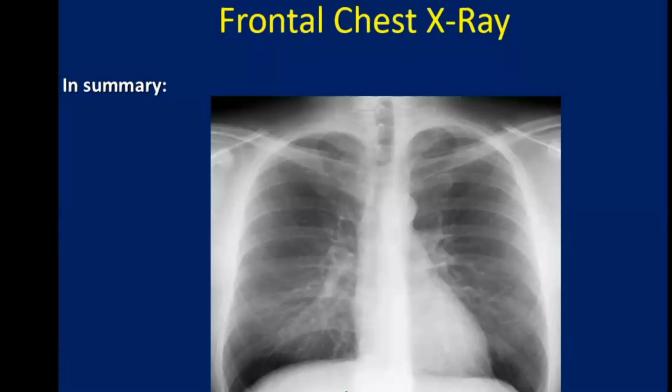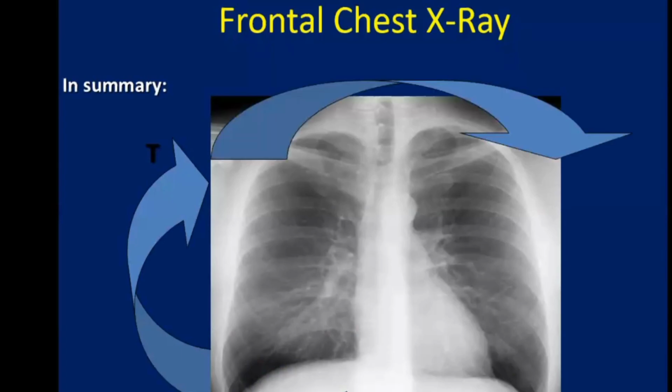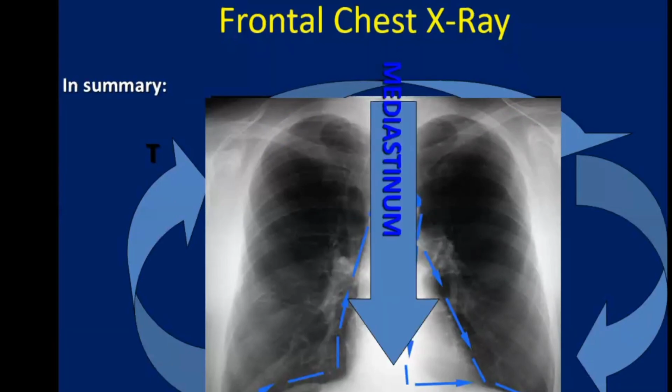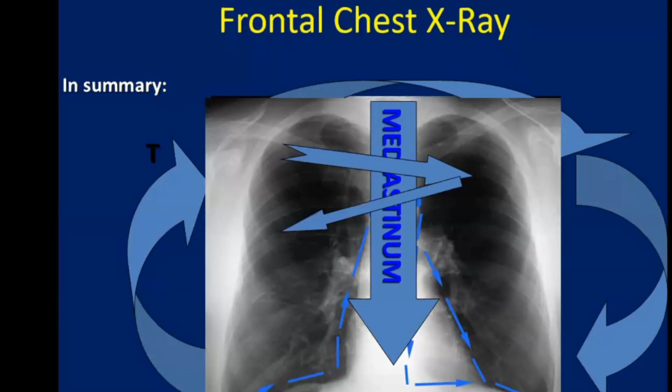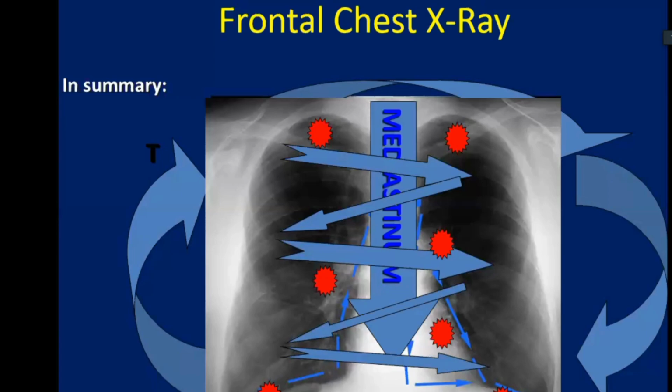When you check an X-ray, start with the margin of the examination: the abdomen, thorax, and the soft tissues. Then you check the cardiac silhouette and the diaphragm, in addition to the bones. You assess the mediastinum for widening or abnormal configuration. And the AHA, which is the apex, hila, the heart, and the abdomen, which is the subdiaphragmatic area.